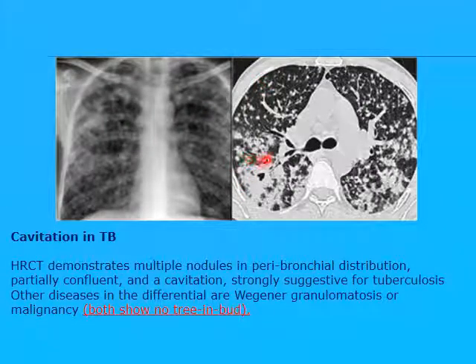TB, secondary TB, can present by area of consolidation pneumonia, nodules, and fibrotic changes. The magic word to tell that we have TB is the presence of cavitation. Okay, presence of cavitation is famous in TB pneumonitis. Also, we have tree-in-bud nodules, denoting that this lesion has ruptured into our bronchus with endobronchial spread of infection.